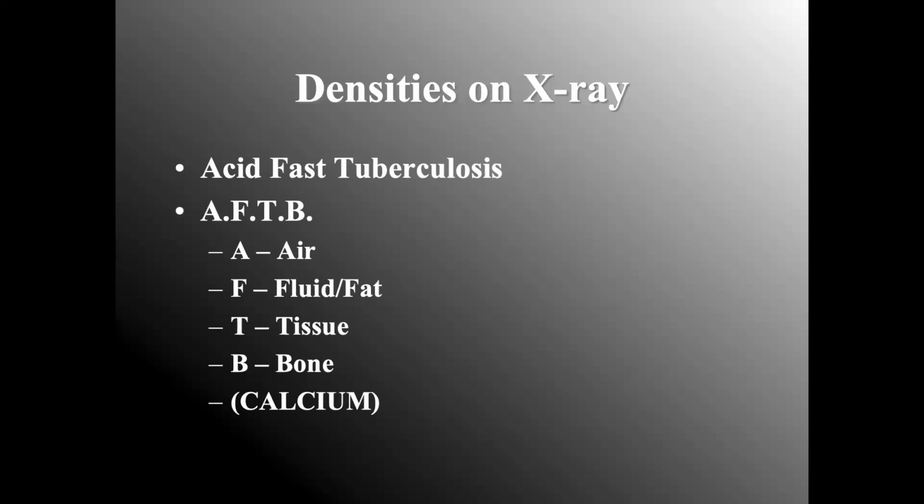I mean, chest X-ray interpretation can be extremely vague at times, given the limited color scheme. We're literally dealing with various shades of black or white. And yes, there's some gray, but it's all black and white, little gray mixed in. Well, density does have meaning and relevance. Case in point, let's explore a bit here. On X-ray, there are two main densities. There's radiolucent, which is black, and there's radio-opaque, which is white.